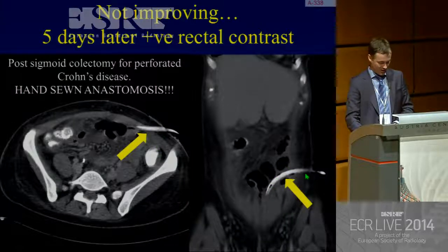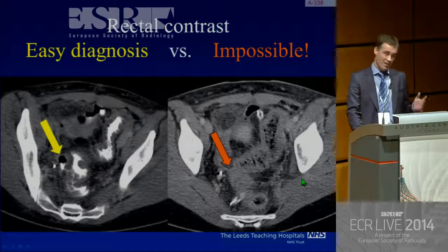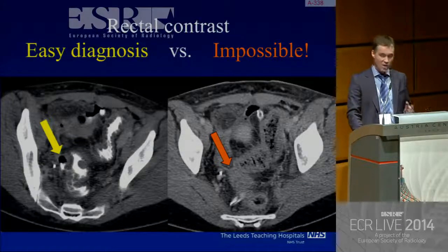And there we can see the contrast again. So the reason why you want to give rectal contrast is because it converts an impossible diagnosis into actually quite a straightforward diagnosis. And the only way to do that is actually to give the contrast rectally.